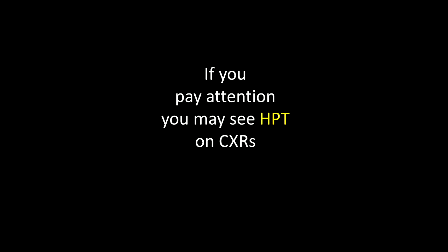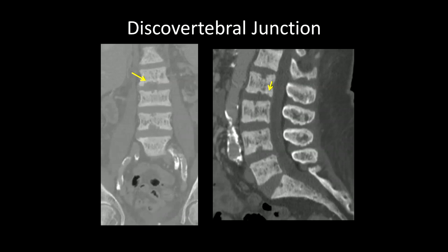So the good news then is even if you only read chest x-rays and pay no attention to bones, you will occasionally encounter this diagnosis of hyperparathyroidism. And finally, we're used to looking at Schmorl's nodes on radiographs and CTs of the spine. Be a little bit careful labeling everything a Schmorl's node because occasionally you will see cases such as this where it's not one dominant erosion in the middle of the vertebra, but multiple smaller erosions in atypical locations.